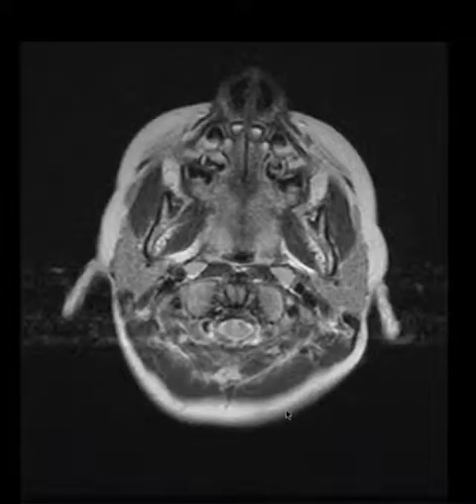At this particular slide, we are at the very upper aspect of the spinal cord. The structure here is the spinal cord, where the spinal cord has not gotten to the brainstem yet. This structure here is the vertebral body of the C-spine, most likely either C1 or C2.